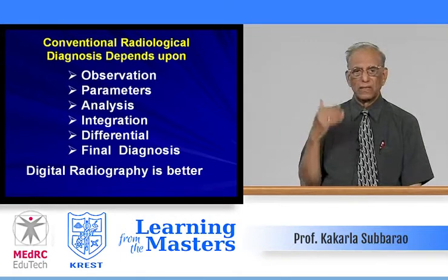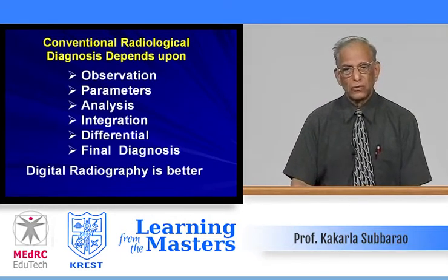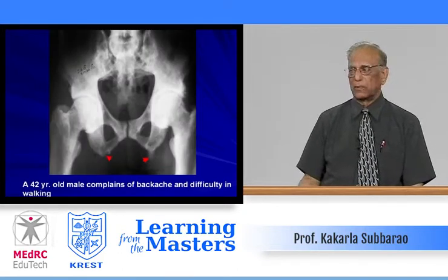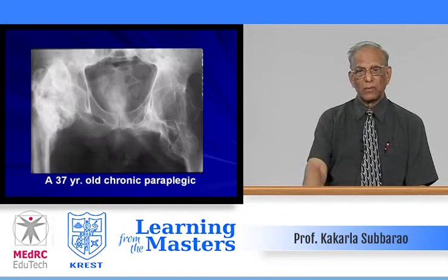As I said earlier, digital radiography is much better today than the usual old conventional radiography. Particularly, for example, this case: a 42-year-old male complains of backache and difficulty in walking. What are the various findings that you see? What will be your diagnosis? Think for a moment and write down.